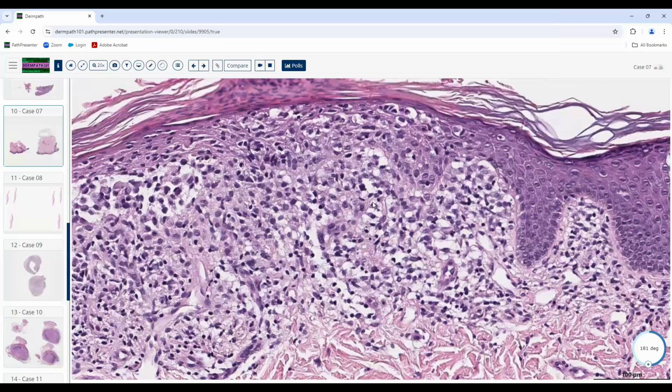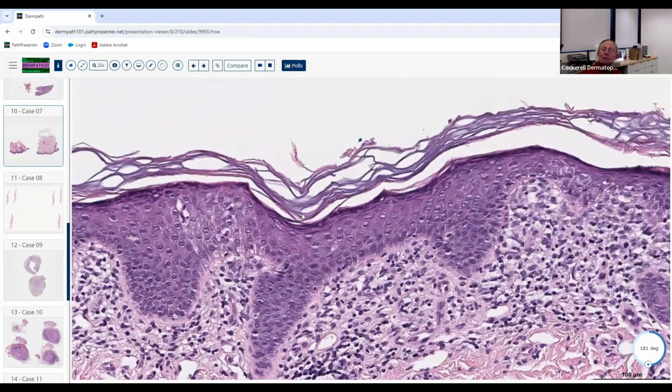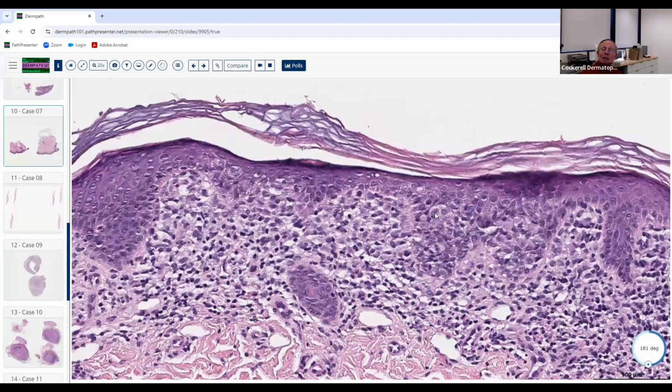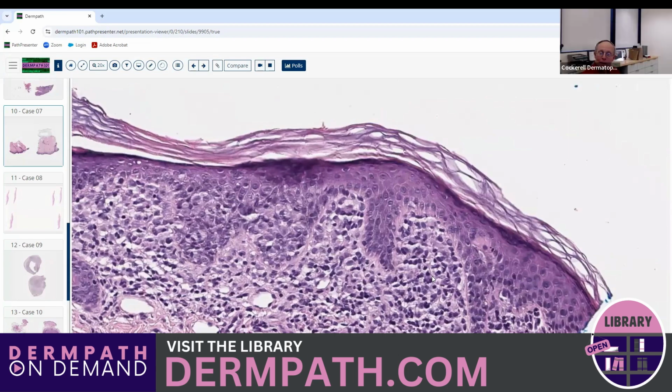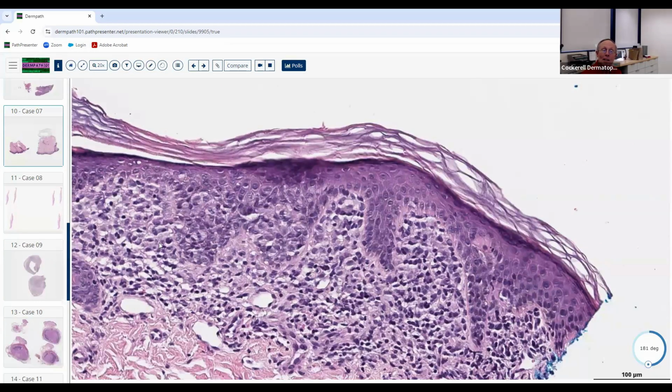Mast cells? Okay, mast cells, good idea. Those usually have mast cell granules, so they have more cytoplasm than a lymphocyte, but they have the fried egg appearance in cross section, and the hot dog appearance cut in longitudinal section. But notice that some of these have what look almost like kidney bean nuclei, and notice how they're getting sucked into the epidermis. They're epidermotropic. So what other cell likes to live here that's got a lot of cytoplasm? Langerhans cells? Langerhans cells. Good. So what's the diagnosis?